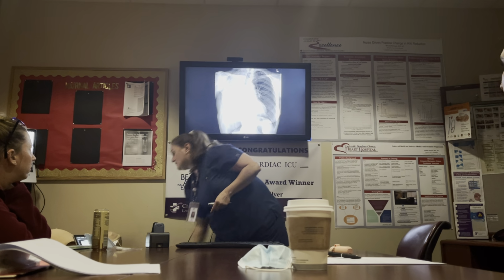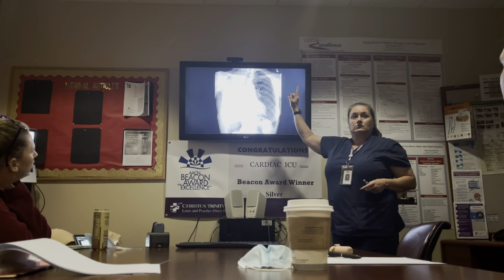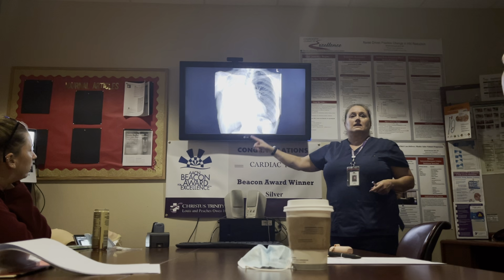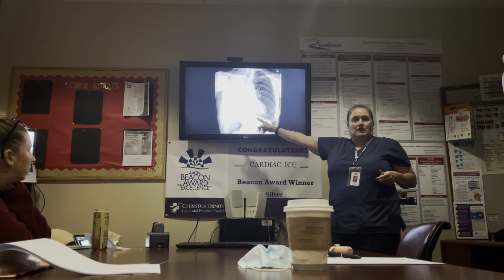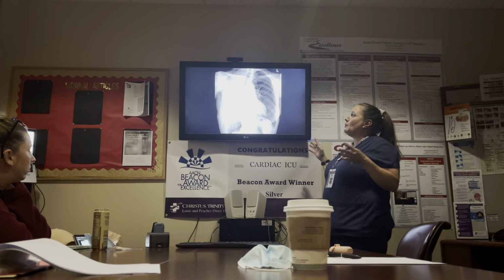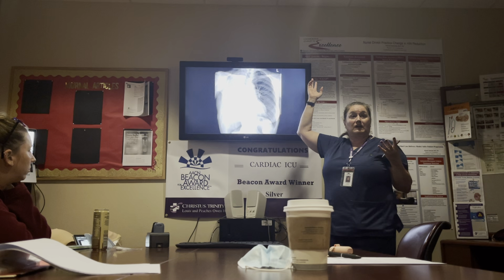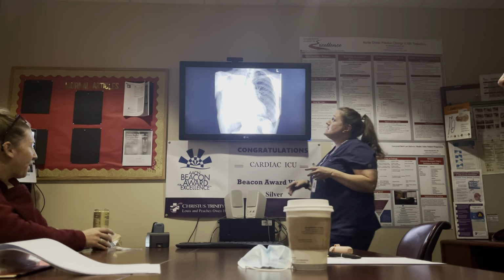So going back to this film here, this is an actual pneumonectomy, okay? You cannot do anything to this. If you try to take fluid out, it's just gonna fill the space again. So it's a moot point, it's just gonna be that way, okay? Because something's gotta occupy that space. We don't put a styrofoam or something in there to replace the lung.